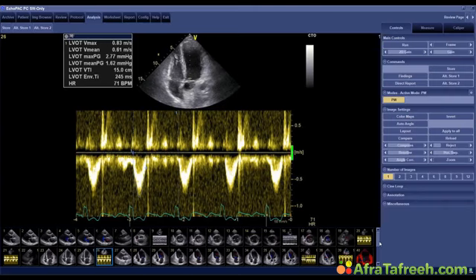So it's like a good or bad kind of signal. In reality, I'm not much of a believer of this index because it just means if someone is sick or not sick, and it does correlate, of course, with prognosis and many other things, but I don't think it really gives you much additional information aside from what you see here as well.